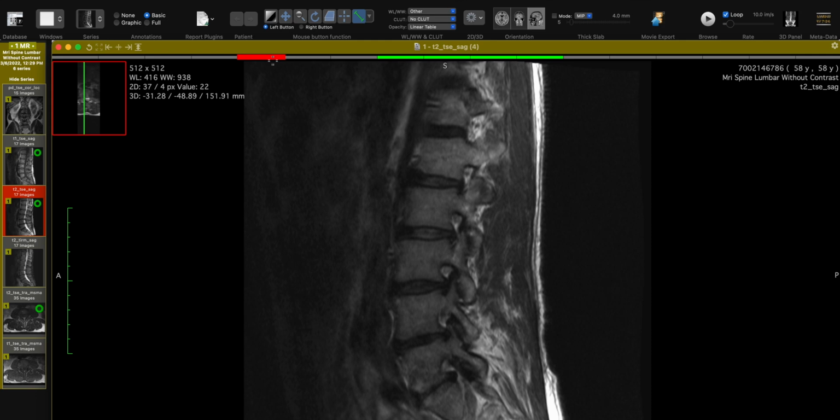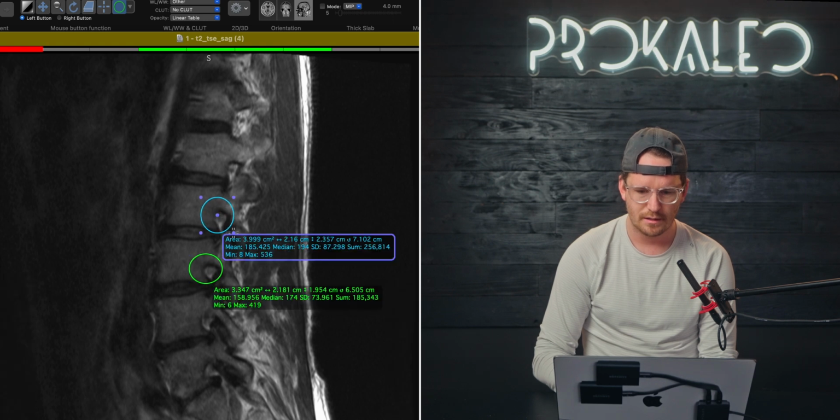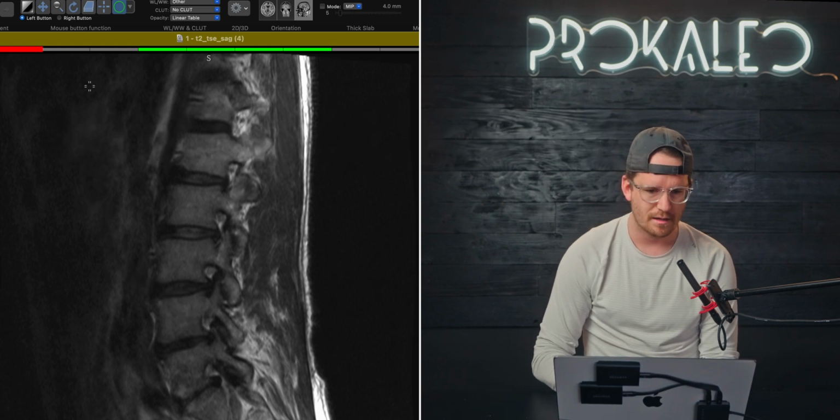So as we go, see those foramina? This is okay. This is cool. I mean, patient, I'm sorry, but this is cool for you to see. Foramina. See how clear that is? See how not clear that is? This just should be a pretty nice circle, and this isn't that nice of a circle.